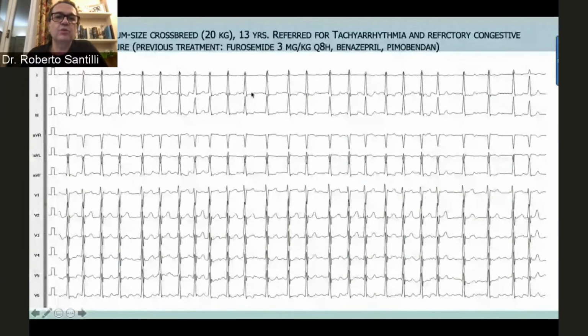So first of all, I look at the interatrial septum. So this is lead 2. And you see that the interatrial septum, remember, this is an important muscular part of the atria, is fibrillating with very, very tiny F waves. Why are we doing this? Because we want to classify the atrial fibrillation as paroxysmal, persistent, long-standing persistent, or permanent. So usually when you have all the atria with tiny F waves, just like this one, these are considered long-standing.